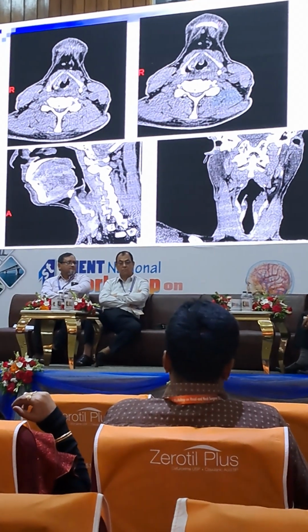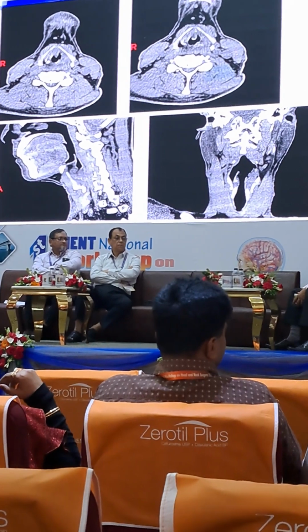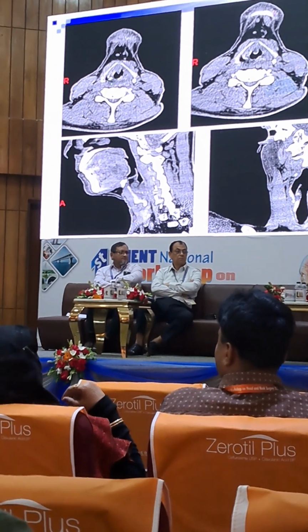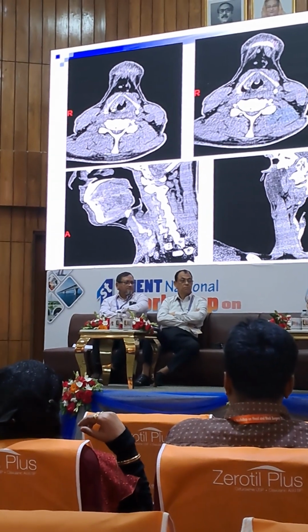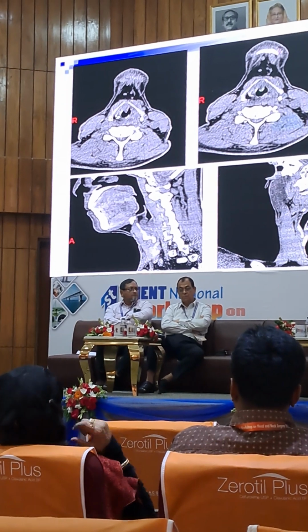There is a tumor of upper stage of supraglottic tumor. We see both the right and left sides of the supraglottic tumor, extending into the anterior part. The same here is the piriform fossa. This is the upper part, and this is a little bit lower part of the lesion.